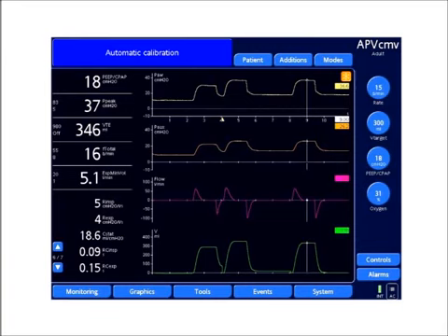So what we have here, we're in APV mode, and APV mode is a pressure control based mode. It's an adaptive pressure control, and this is what the manufacturer just calls it. Another name for this on another vendor is PRVC for Servo ventilators, or AutoFlow for Dräger type ventilators. And we're looking at a lot of values.